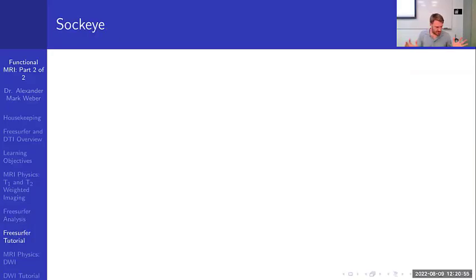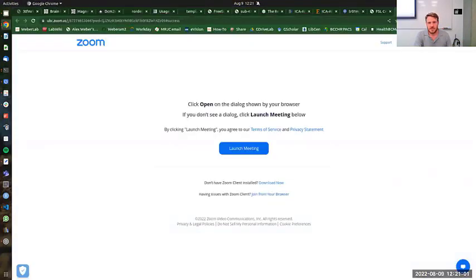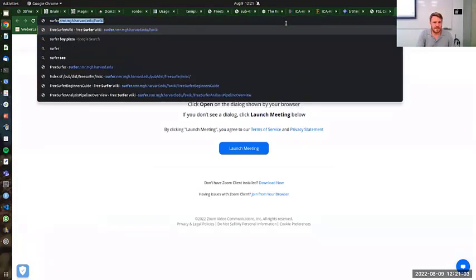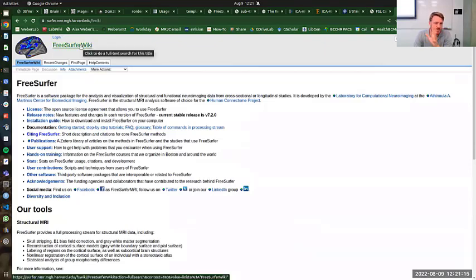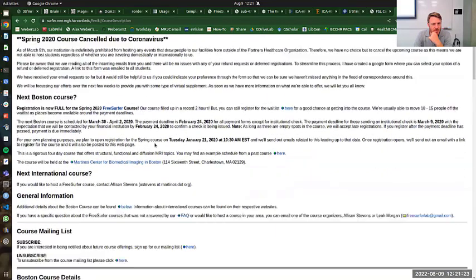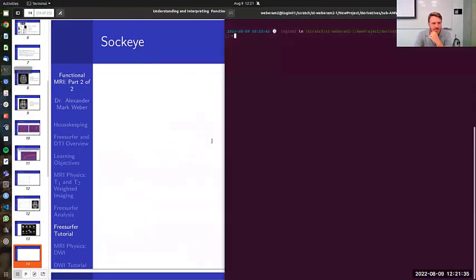Okay, so I know that was a very quick summary of Freesurfer. Again, I'm not super familiar with Freesurfer, but if you have questions, essentially you can Google Freesurfer. They have a wiki. I believe they do have a course that you can take, hands-on training maybe. I do believe there is an online course in here somewhere. So they will have resources, but today I'm going to show you how to run this on Sockeye.